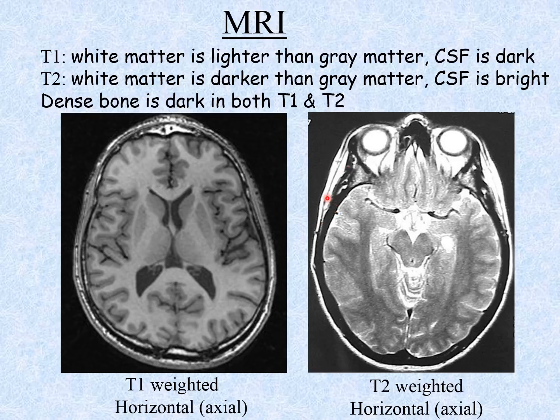And again, we see the skin is very light because it has lots of fluid in it. We see here the midbrain, the cerebral aqueduct, and temporal lobe, and in this case, there happens to be a tumor that is loaded with fluid so that it appears white.